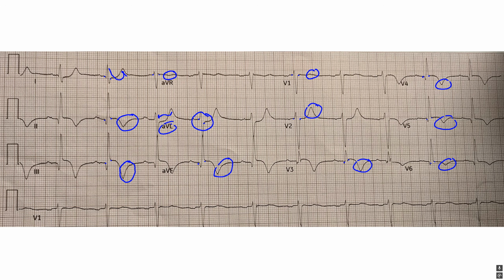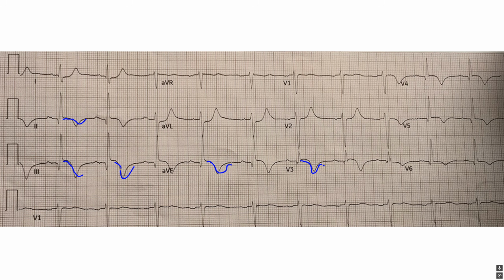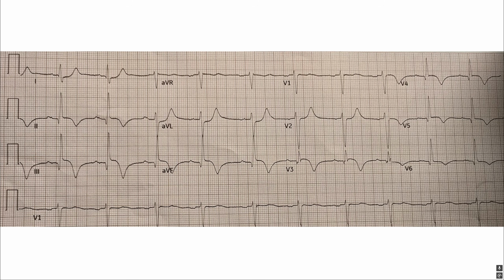So right off the bat, we already know this qualifies for a STEMI based on the American Heart Association's own criteria. But the thing here is the appearance of these ST waves, like this elevation here with this kind of sloping down biphasic shape, to me is indicative of a subacute infarct, that the infarct has happened probably greater than 48 hours ago. Okay, but again, regardless of what I think, I said, hey, this looks like a subacute infarct. And he's like, yeah, good call. The troponin was elevated. She got cath eventually.